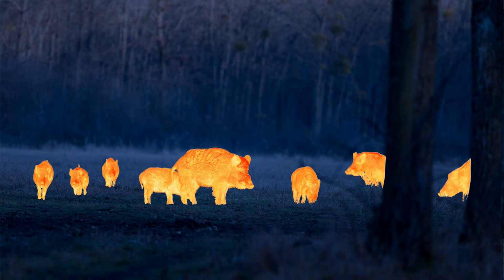Now these wild boars here, which we are seeing because of their body heat, are showing up so beautifully in the infrared camera. Now they obviously are not red or pink in color, so they are being shown in pseudo color. So this is not the true color of a pig. But just imagine, without this technology of the infrared camera, you would not have seen the pigs at all. In other words, we do see things in pseudo color in multicolor imaging, but we get to see much more than we can ever see with a true color fundus photo alone.